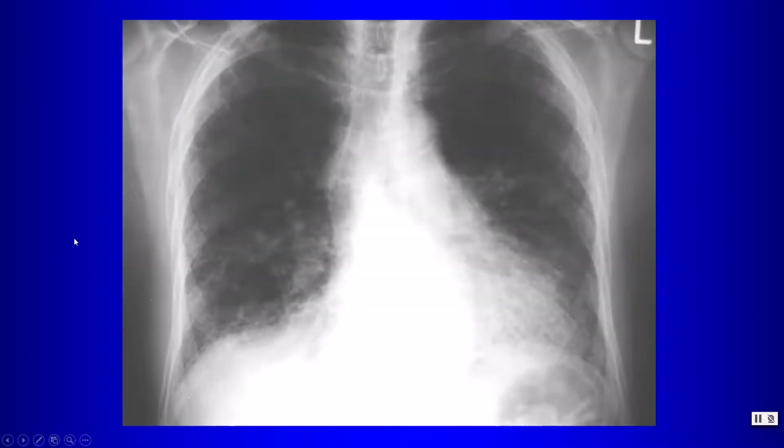If you're not sure if there's interstitial lung disease on a chest radiograph, on the frontal view, the lateral view is often very helpful because the retrocardiac region should be relatively clear. When you look at the retrocardiac region on your lateral view and you see interstitial disease here and you see these reticular abnormalities and these tiny little holes, then we know that there is interstitial lung disease in this patient.